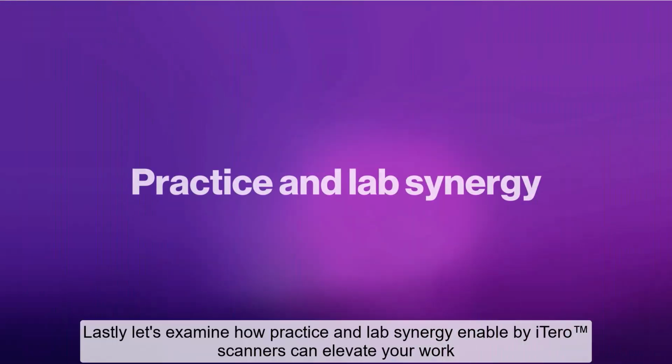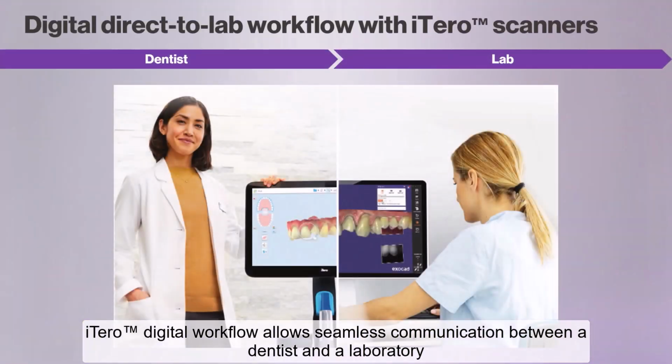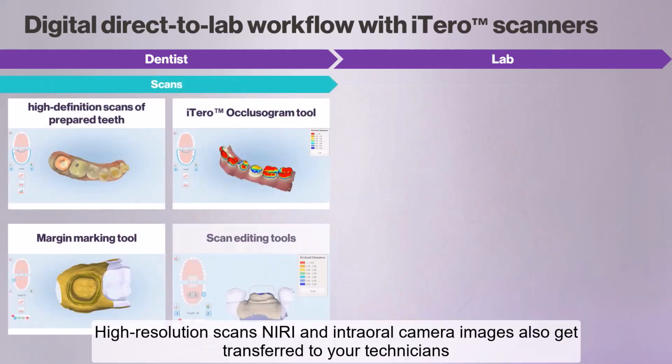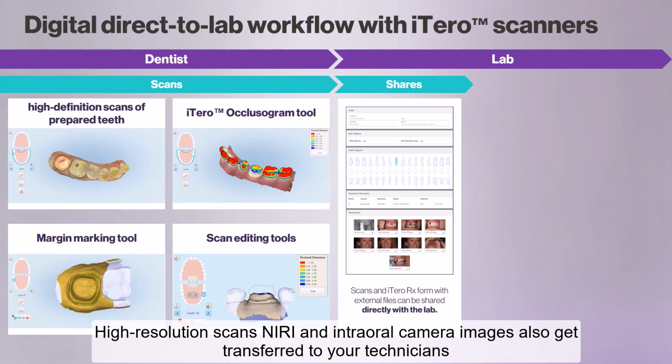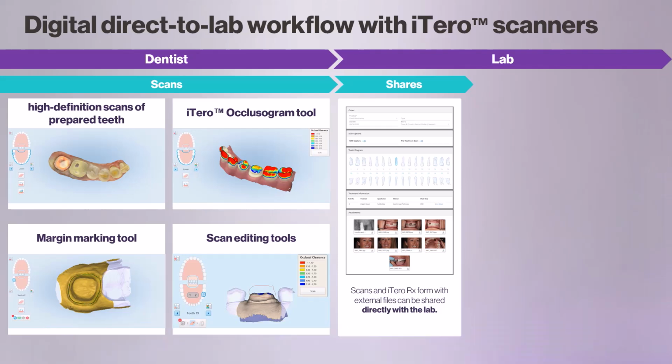Lastly, let's examine how practice and lab synergy enabled by iTero scanners can elevate your work. iTero's digital workflow allows seamless communication between a dentist and a laboratory. High-resolution scans, NIRI and intraoral camera images also get transferred to your technician's exocad workstations. This helps in accurate ceramic layering of highly aesthetic restorations.